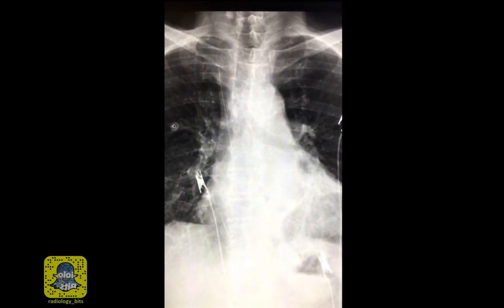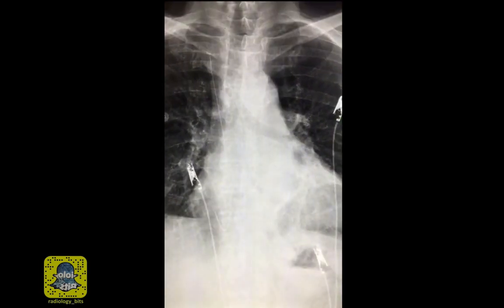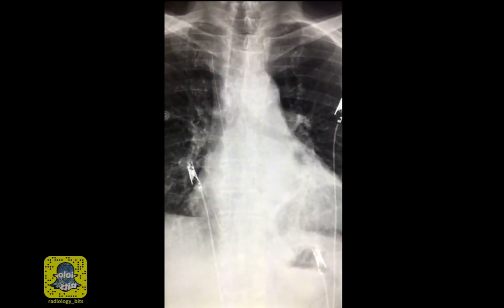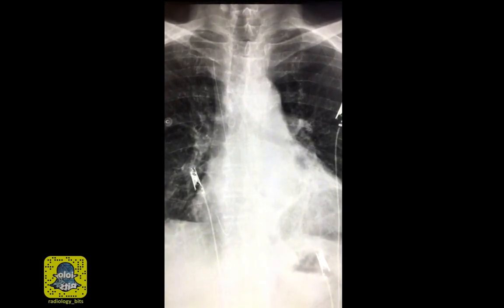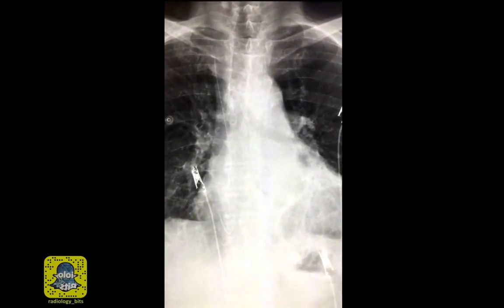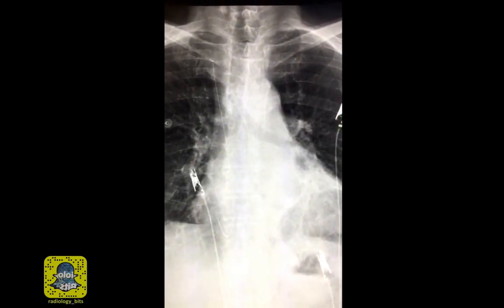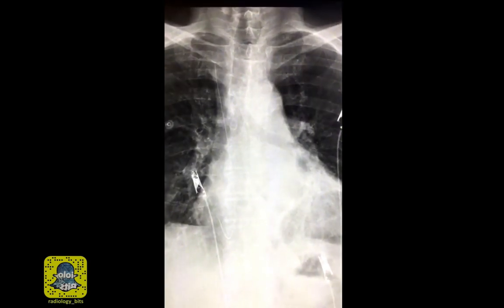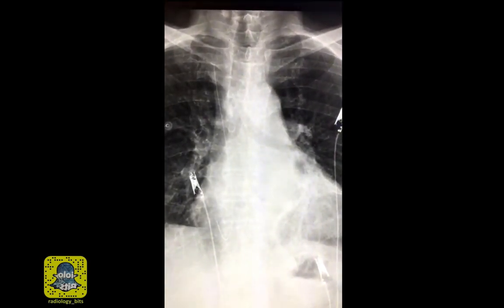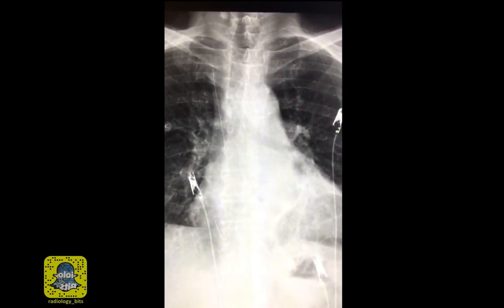This case is interesting, but the teaching points are very basic. First, a very important concept when reading chest radiographs is to start with tubes, lines, and equipment. Account for any support equipment, make sure the course and termination is right, and make sure you don't have extra material there. Second, know your anatomy and try to apply that on the chest x-ray, and this case exemplified the venous anatomy as we described.